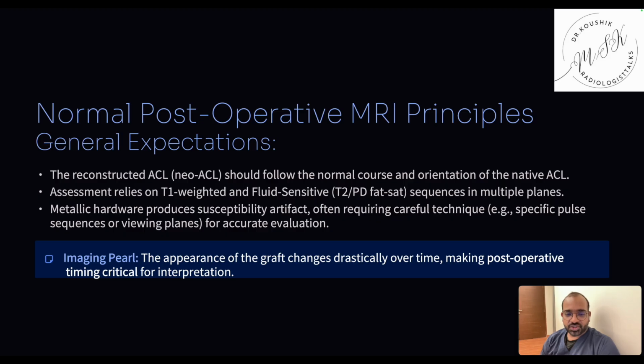The graft changes over time, making post-operative timing critical for interpretation. So we should know when exactly the graft was placed, and how many months it is post-surgery, because the graft signal is interpreted based on that timing.